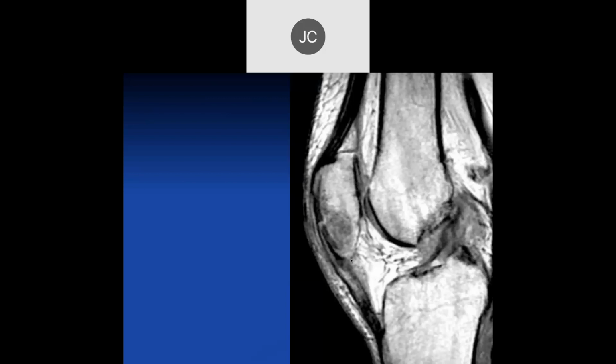Acute trauma to the anterior knee. Yeah, this was an impaction injury. So this is a bone contusion, and this was some tearing of the patellar tendon due to an impacted trauma.